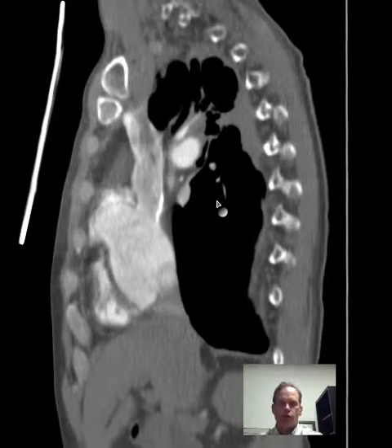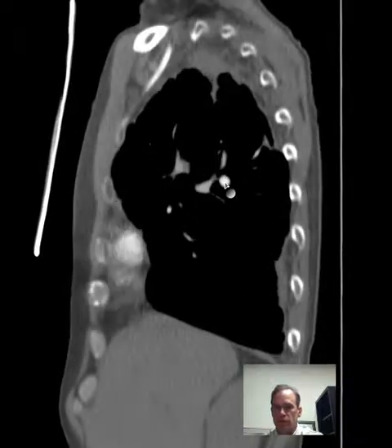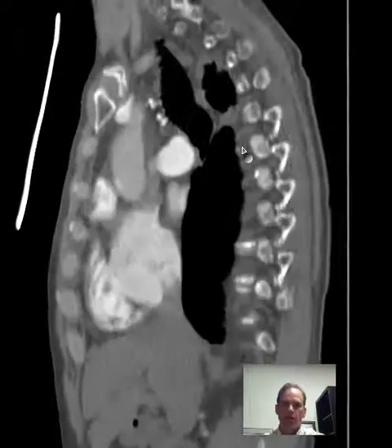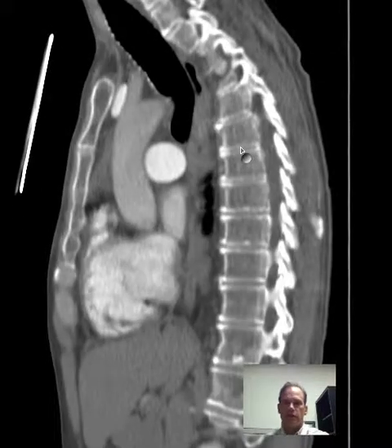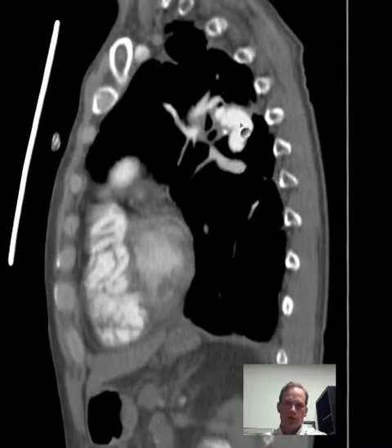Now, we don't use sagittal images very often in the chest. They're probably the third choice. We go through the axials typically, and certainly for a pulmonary embolism protocol, we give close attention to the coronals. We would also look at the sagittals just because it's another chance to look at the pulmonary arteries, and not just the main pulmonary arteries, but here we're referring to the branches.